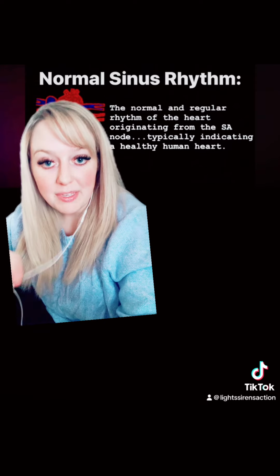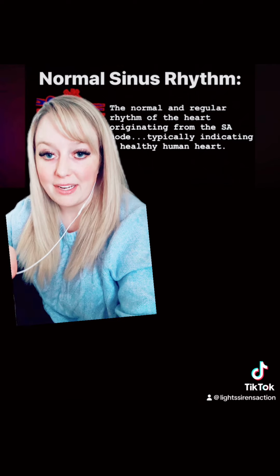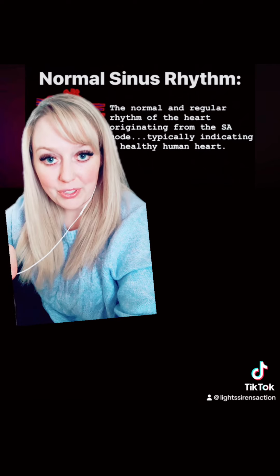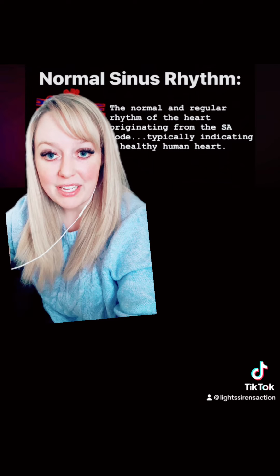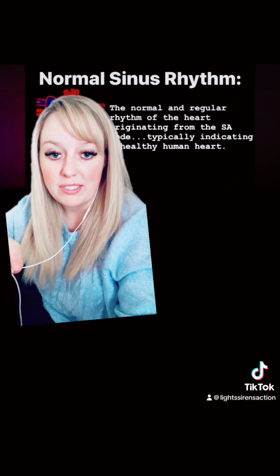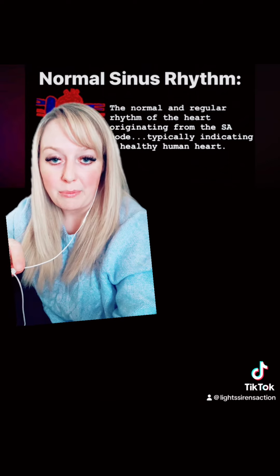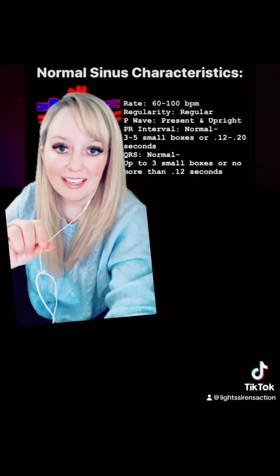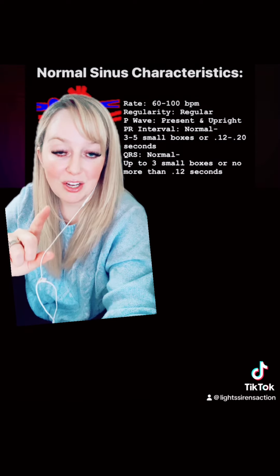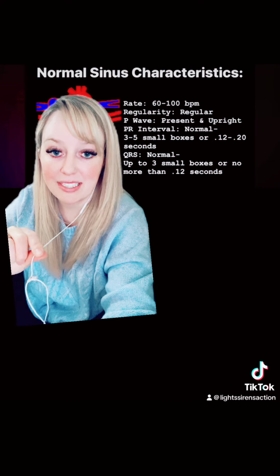A sinus rhythm is the normal and regular rhythm of the heart originating from the sinoatrial node. And the sinoatrial node, I know I've mentioned this in past videos, is the natural pacemaker of the heart, so it sends out the impulses of the heart. Usually this indicates a normal, healthy human heart, but not always. In a moment, we'll look at this on an EKG, but first, let's talk about what we're actually looking for when we look for all the characteristics of a sinus rhythm.